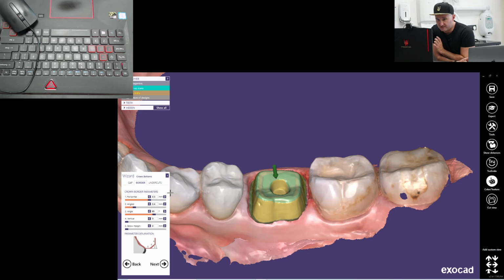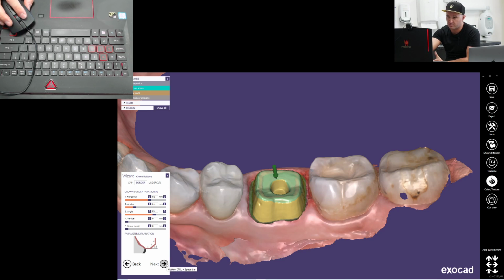So you need to set it a little thicker, and in post-production smoothen it to make it sharp as a knife with your bur. So we do it manually when your crown is ready. You need to remember about it, because if you set it like here, your crown will be destroyed by your milling machine during the milling process. So this is very important if you don't want to redo your job. It's better to do it manually than start all over again.